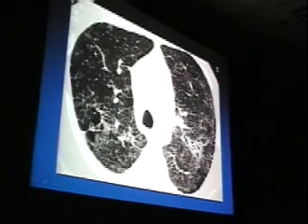Now, this patient has a different pattern on high-resolution CT. In this case, the predominant pattern are these irregular areas of linear opacity. Now, in this area, it's become more conglomerate. We may actually identify some fibrosis here as evidenced by traction bronchiectasis, a little conglomerate fibrosis. We see all these irregular areas of linear opacity, which are not discrete thickening of interlobular septa. There are also a few scattered nodules.